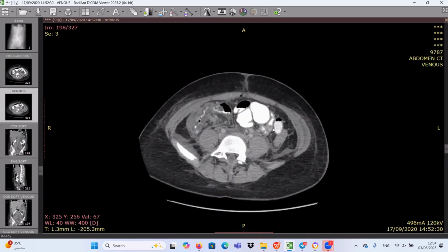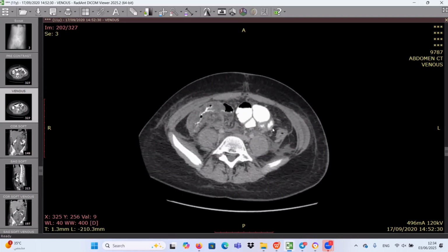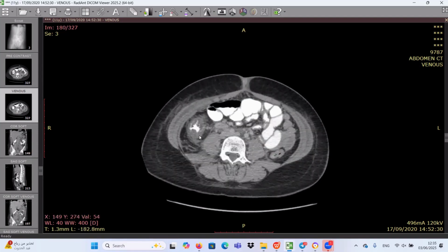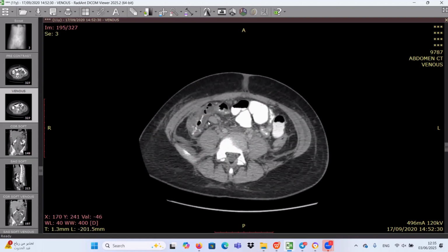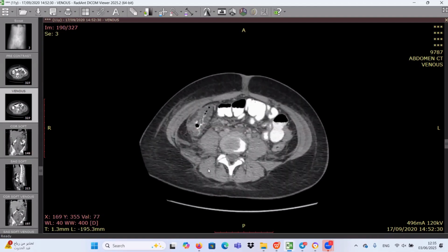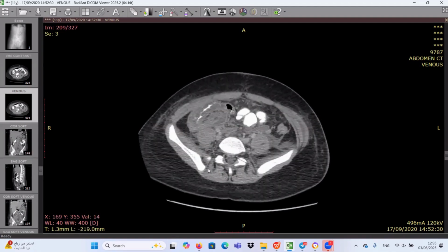Maybe bacterial peritonitis, secondary to complicated appendicitis, maybe secondary to the surgical interference itself. And as you said, we have here colonic mural thickening, most likely colitis, maybe inflammatory, reactive inflammatory changes, post-operative, maybe infection, maybe, as you said, typhlitis, but we don't have any history suggestive of typhlitis, so we think maybe pseudomembranous colitis secondary to appendicitis. I think this one is more logical.